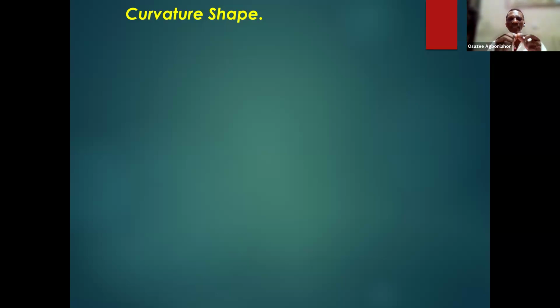So you see that thinness is usually synonymous with bulging. I don't know if that makes sense. And that's what you see exactly in keratoconus, where there's gradual thinning of a particular area of the cornea, and that area just bulges forward naturally because it thins out.